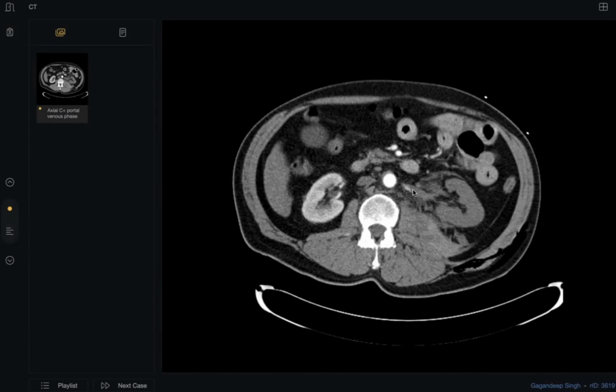See the artery? I think the artery is completely lost. You are correct, by the way, but the first priority is the arterial supply. So what do you think is the next management? I will call the interventional radiologist and do DSA, and if there is thrombus, maybe it is not a complete obstruction.